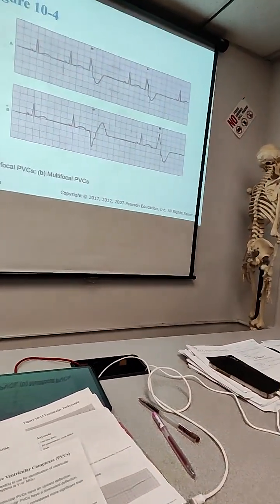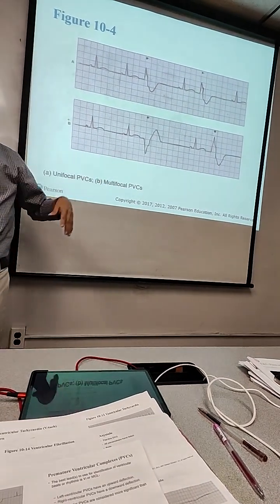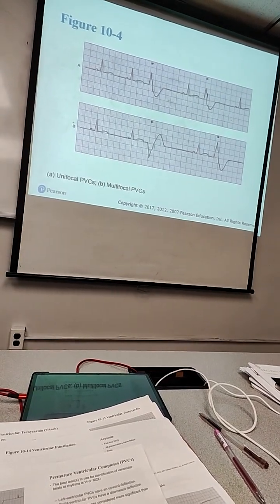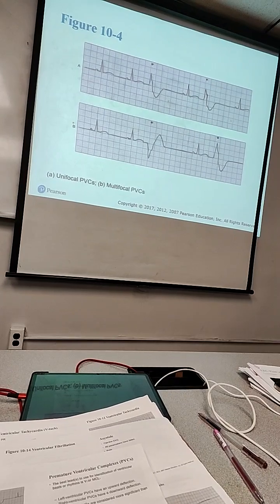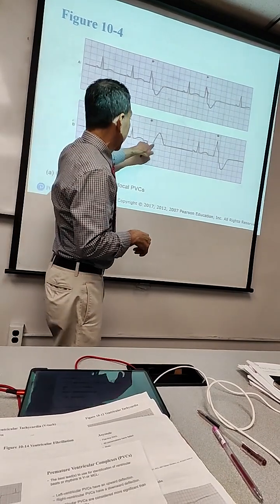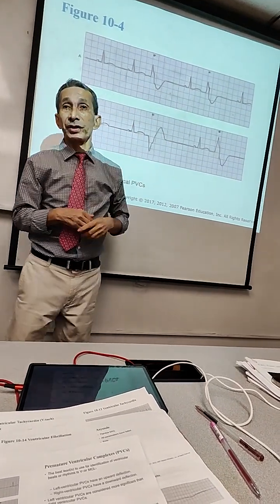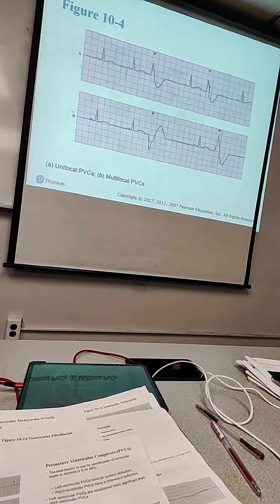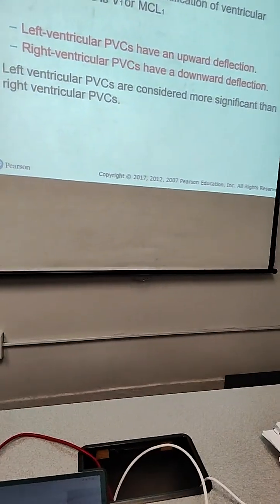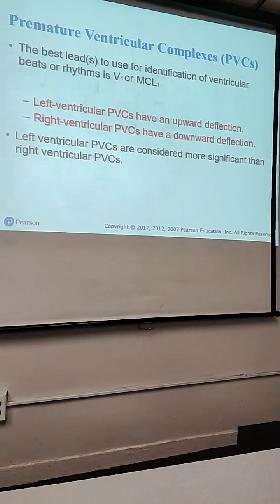And what part of the heart is failing right here? What is the problem with the heart? What part of the heart is not working properly? Ventricles? The ventricles. Because the ventricles are the ones that cause the QRS and the T. In both of the pictures it is the ventricles. Now we're going to explain why those changes.